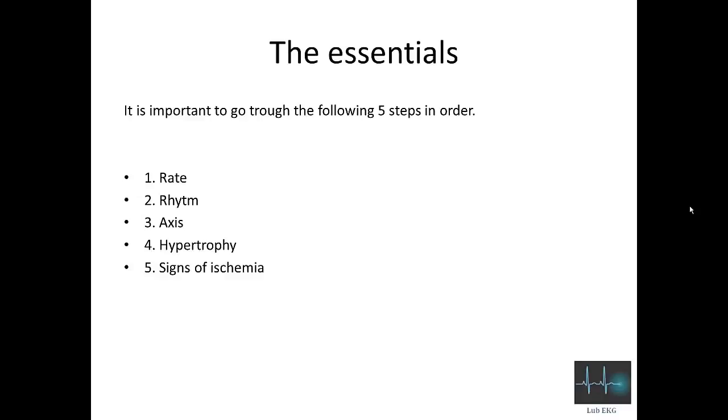Okay, so in the previous movies you were shown these 5 easy steps to analyze an ECG strip. Just do yourself a favor and use these 5 steps every time you analyze an ECG strip, and hopefully you won't miss anything important. This should cover mostly the basics. I'll just go through them to refresh your memory.